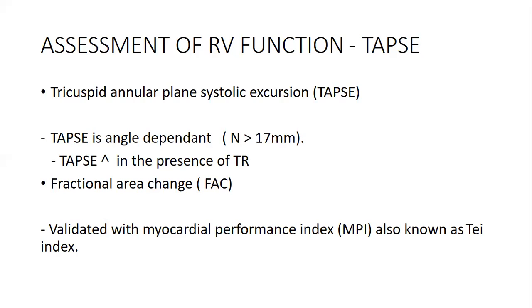No wonder it's very important for somebody practicing cardiac ultrasound to know that certain parameters on echo are actually limited and they may not give the true, accurate picture of the image you're doing. However, I should mention that these parameters help us to have at least a clue on how you can quantify this.